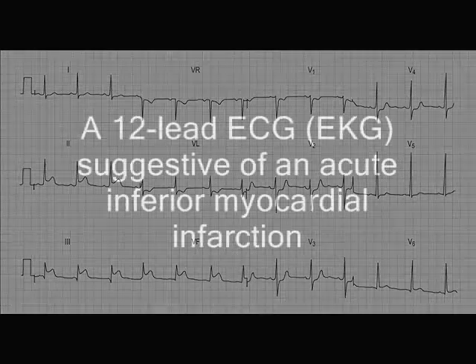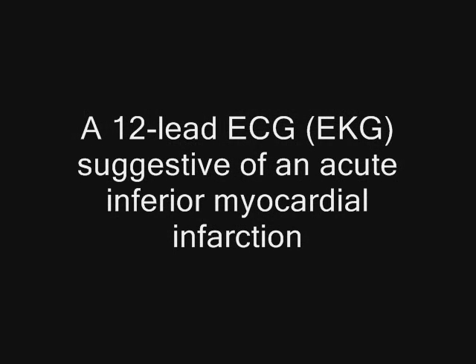So what we're seeing here is a patient with a very steady heart rate. They're in sinus rhythm, and they are demonstrating signs of an acute inferior myocardial infarction. But again, you use the 12-lead ECG as part of a holistic assessment, and you need to see other signs, clinical history, and other measures such as biochemical markers to be absolutely certain that is what the patient is experiencing.